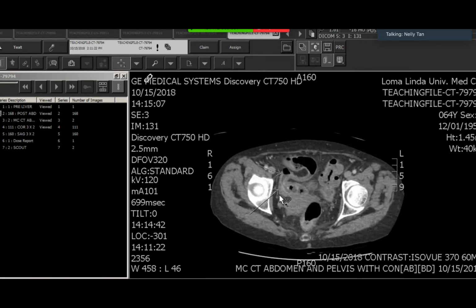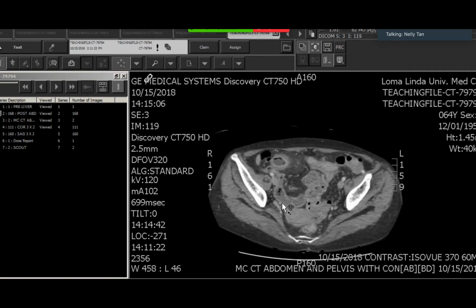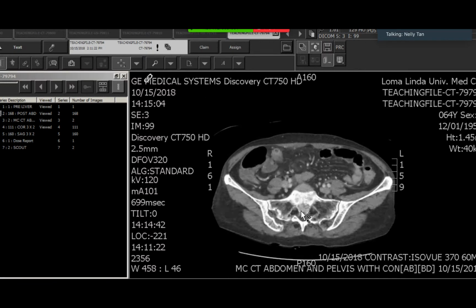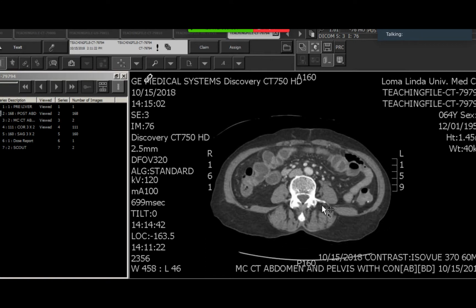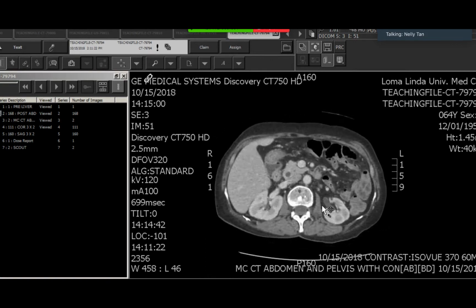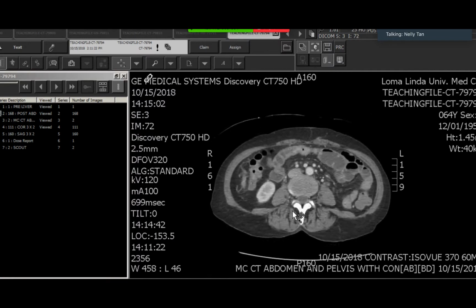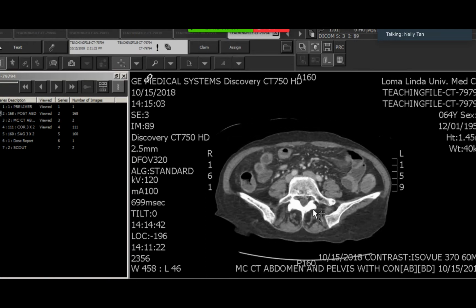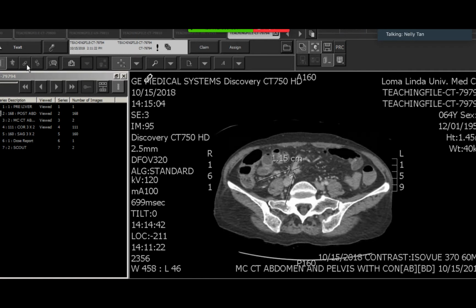Here, there's some colonic hyperemia, a little bit there too. And there's stranding here. And then there's some lymphadenopathy. Let's see. Oh, there's a bone island. So I sort of gave this a non-specific differential diagnosis. Nothing in the liver. Where is the lymphadenopathy? Oh, there's more bowel. So it's scattered multifocal bowel abnormalities, a little bit of lymphadenopathy.